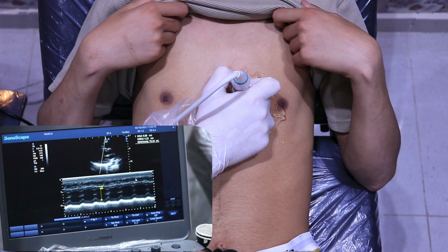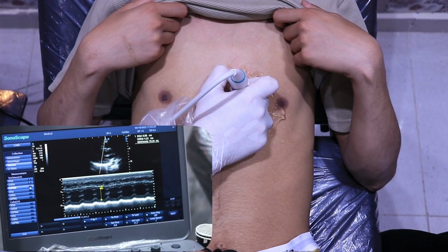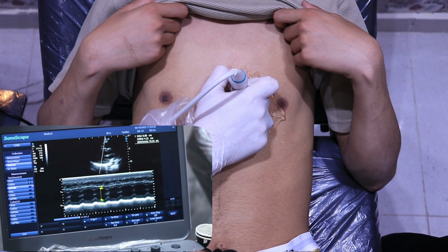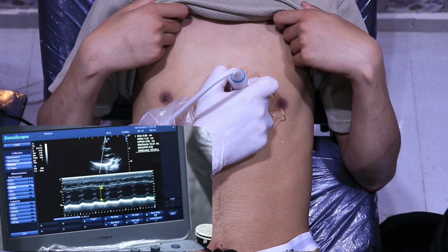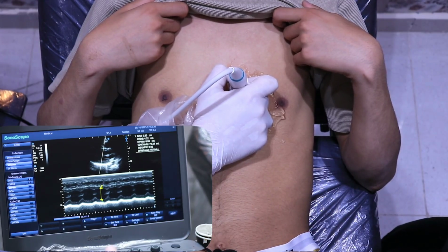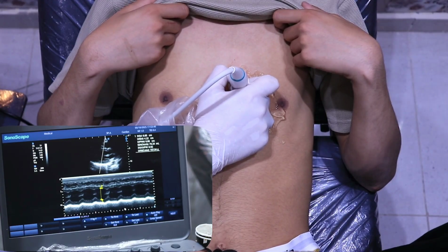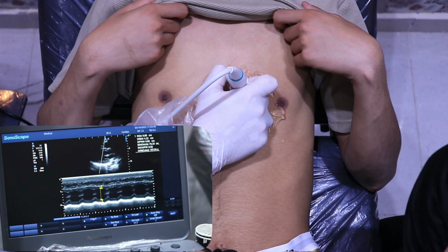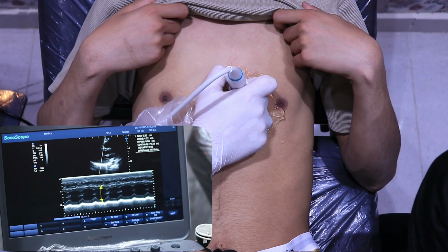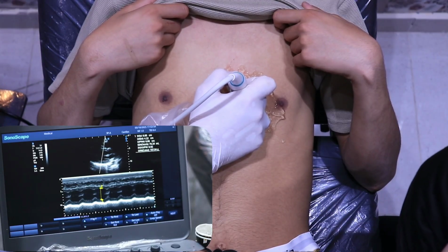So now I'll go back and measure the posterior wall. So this is the posterior wall, right? During diastole. We'll go from here till هنا، كده كويس ولا أكتر شوية ولا أقل؟ You have to select your cursor. شايف يا دكتور؟ ليه أنا ما خدتهاش هنا مثلا؟ Very good. This is the pericardium. So this white, dense, bright line is the pericardium. So the posterior wall is here, right?